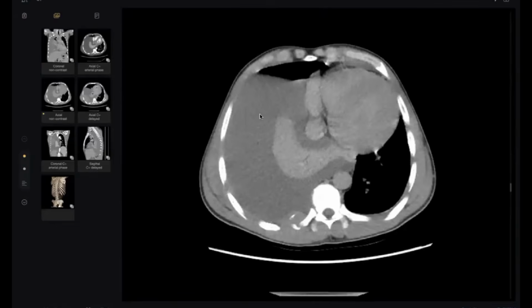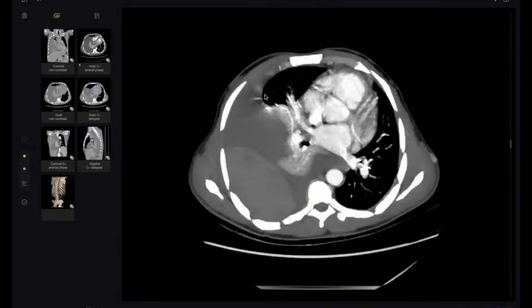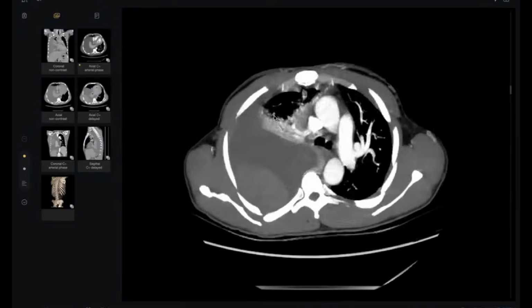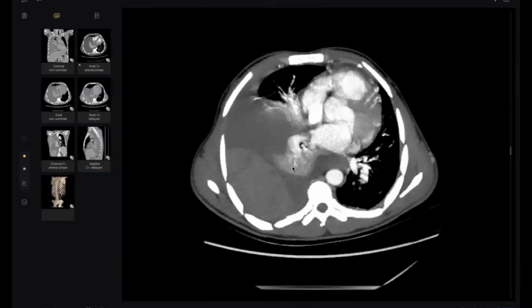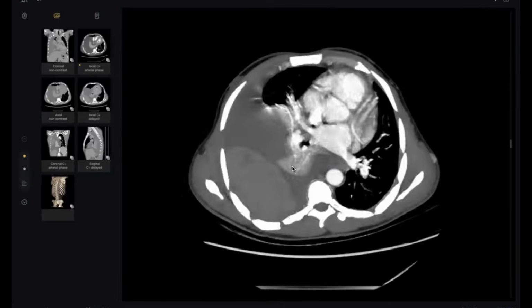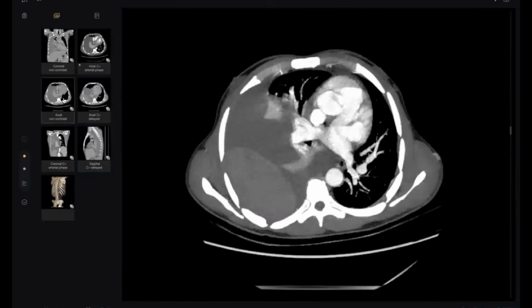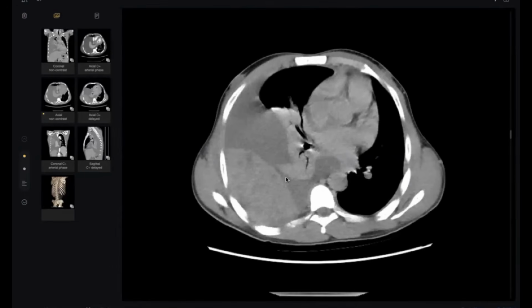Thank you, doctor, really very much, because it is a little bit tricky case. Why? Because it looks like an enhancing lesion, because I gave him the post-contrast. It looks like an enhancing lesion with pleural effusion. Very simple. But he was very wise when he told me I will compare with the pre-contrast. Look here, very hyperdense blood clot.